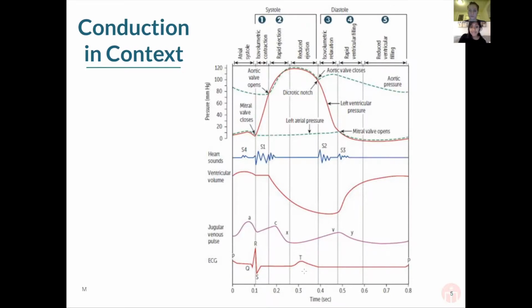And then at the end of systole, we transition to diastole, of course. Now the ventricles are filling again. And that's usually right around the end of the T wave, that's where that initiates, and that will continue until, again, the next QRS complex. And so really keeping in mind, P waves are all about atrial depolarization, right?